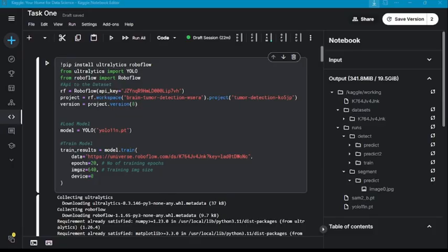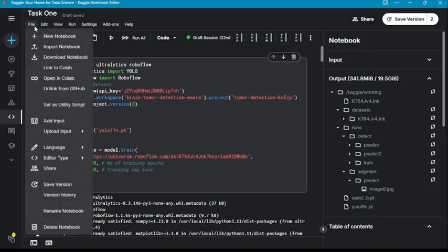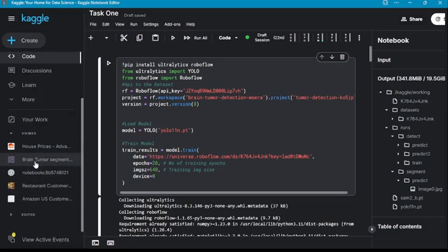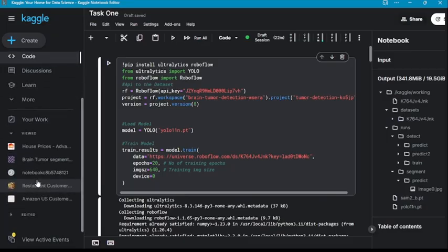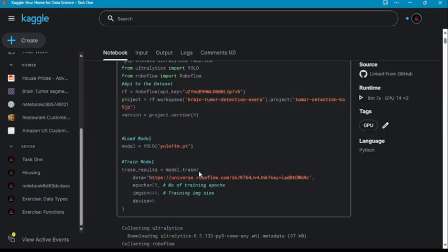Oh, so you can see, hold on, let me, so when I, okay, let me do this. Let me do this. Okay.